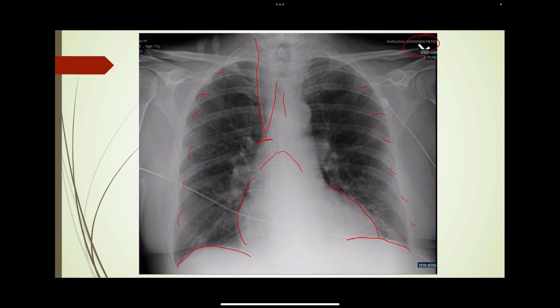So this is just a hair high, but for short-term placement, which is what it would be for if I did it, and I'm sure I'm transferring this patient out because I work at rural hospitals, I'm happy with that placement.